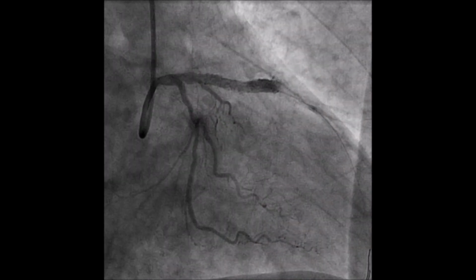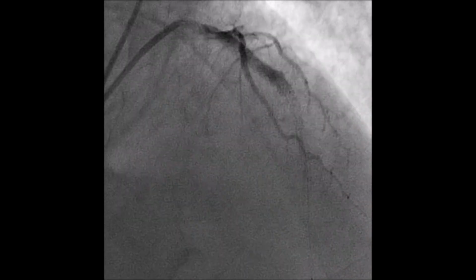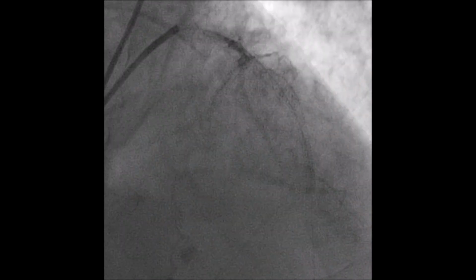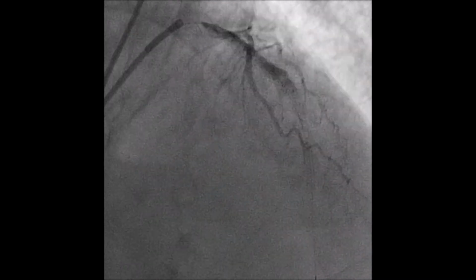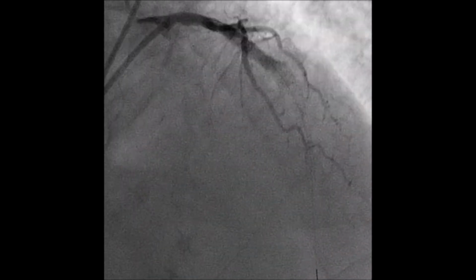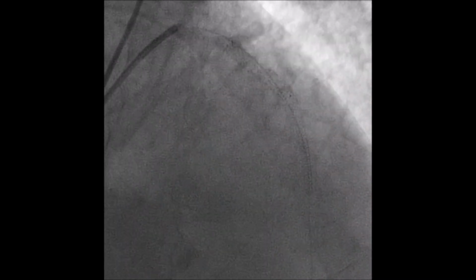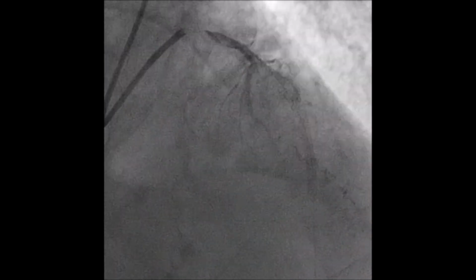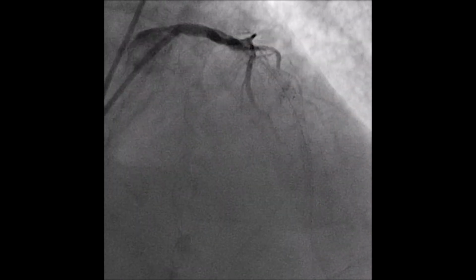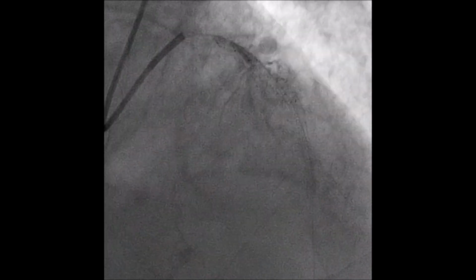The no reflow phenomenon is one of the most severe complications of cardiac interventionism. It involves a decrease of coronary flow due to the obstruction of microcirculation, many times as a consequence of the distal embolization of the coronary thrombus. As you can imagine, these little blocked vessels are not visible in the coronary angiography, and the consequences of this phenomenon are what we can only see. These visible consequences are retention of contrast material in epicardial blood vessels and clinical instability.